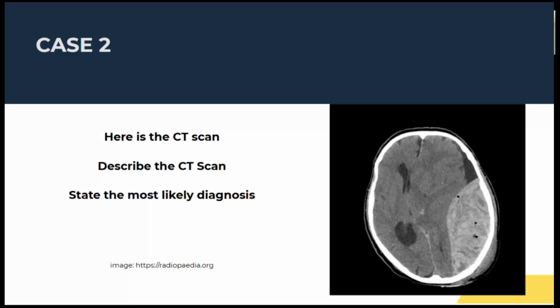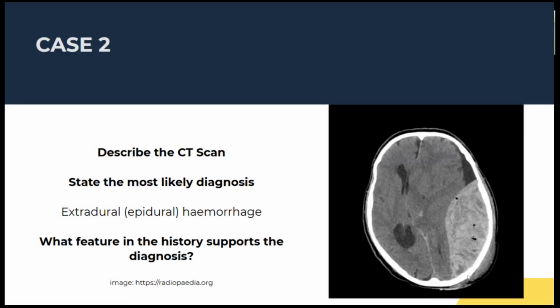Left epidural hematoma and mass effect is wonderful, Max. So you've got your left-sided hyperdensity and convex edge lemon-shaped lesion consistent with an extradural hematoma. The other thing you can see is if you look outside the bone, there's slight hyperdensity outside the bone, and that's just soft tissue swelling next to the hematoma.